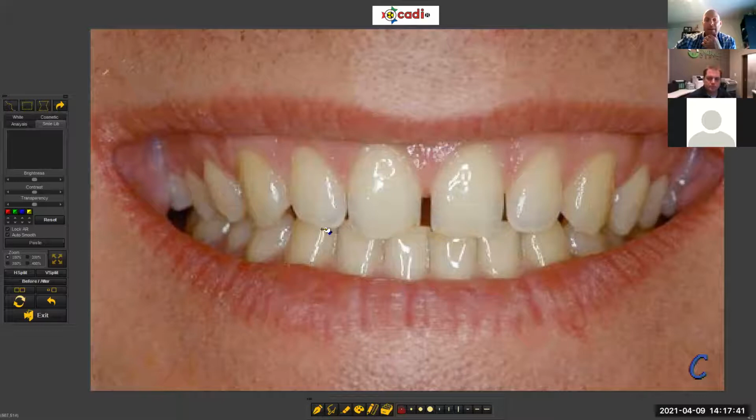But honestly, people moved away from this because of the issue of not being able to deliver what they could do. So most people, when they look at this cosmetic simulation, will do the minor cosmetics that I showed you, for speed, simplicity, and realistic possibilities. That's what they have. But I could probably still get you the Hornbrook library, have it installed into the software, and then I could train you on it if you wanted to do that.